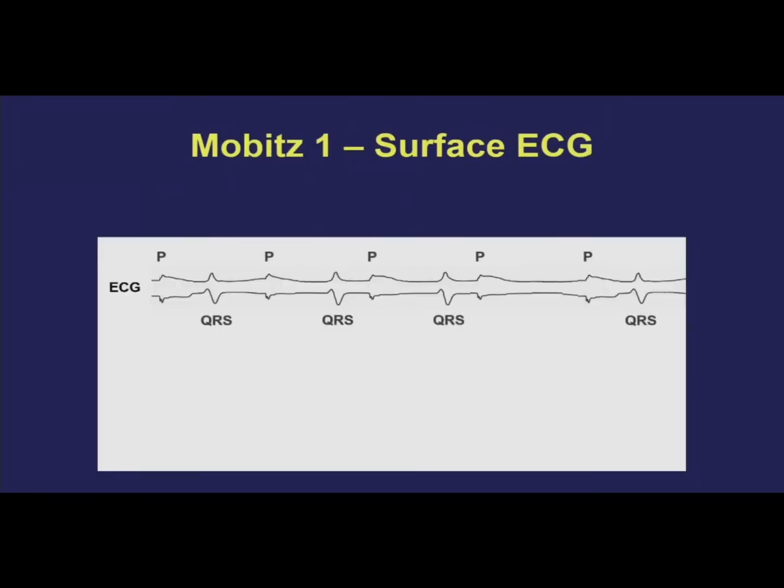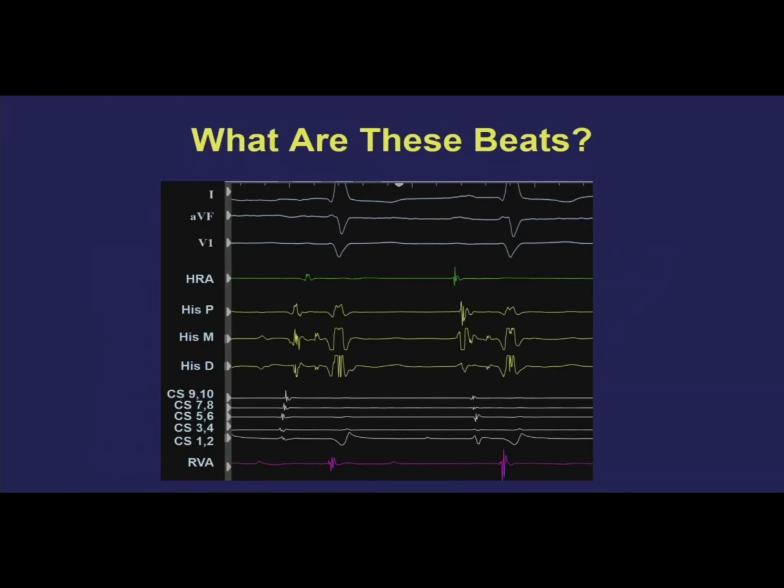Can you make that same assumption based off the vector of the HRA? No. These are all bipolar recordings, and you can't say anything about them by their shape other than the few issues I pointed out earlier: if there's a change, it means the wavefront is different, but it doesn't tell you where it's coming from. A negative versus a positive deflection really has no specific directional meaning with a bipolar recording.